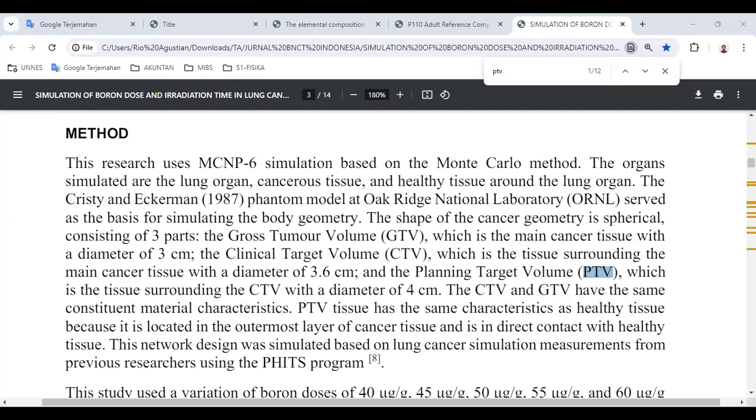So when I create such a phantom, first I'm going to go to lecture 1 and search input, and then I copy one of these, like lecture 011.